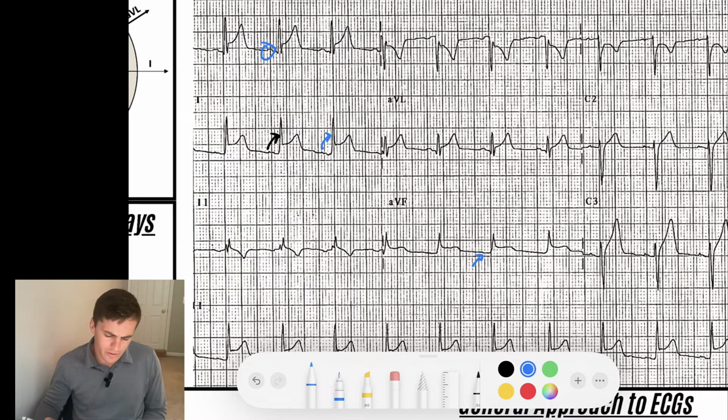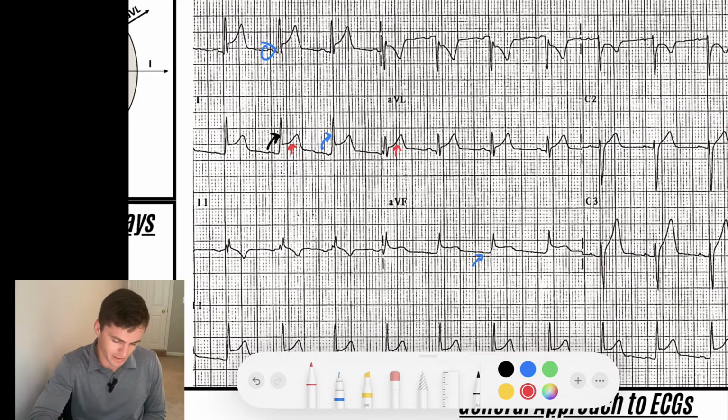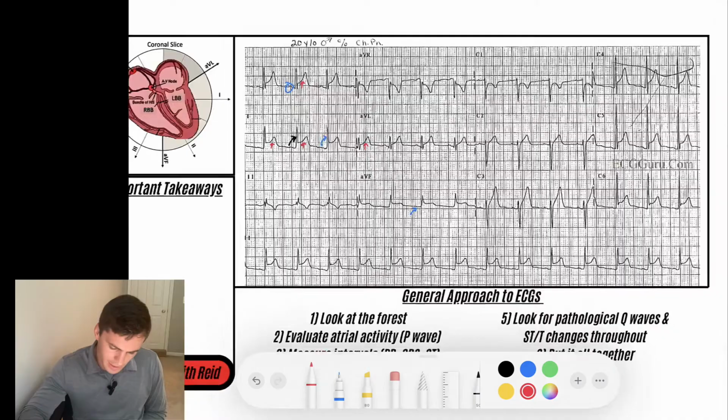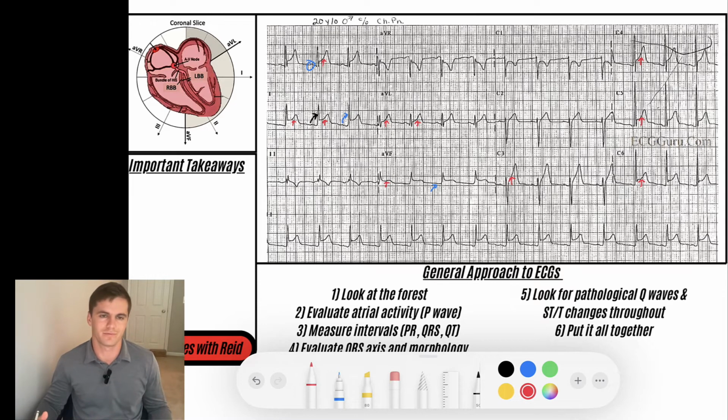And so what I noticed right out the gate is I've got some ST segment elevation in some leads. And so I think, oh my gosh, maybe this is chest pain and MI? But you'll see I've got ST segment elevation in lead 1. I've got ST segment elevation all the way through a lot of this ECG, right? Got ST segment elevation in lead 3, V4, V5, V6, AVF, AVL, lead 1, lead 2, lead 3. It's throughout the strip, right?